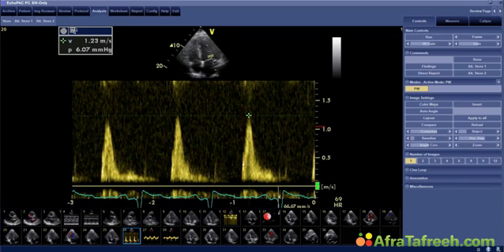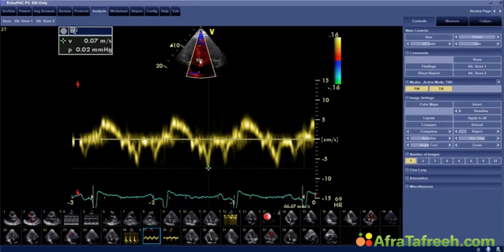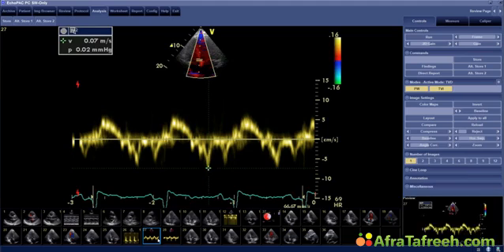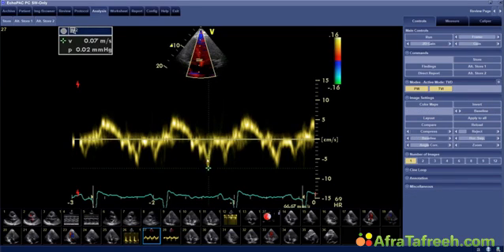So what you can do with this signal is you can look at the left ventricular filling pressure, and you can do the tissue Doppler at the base of the mitral valve. And what you can do then is you can look at the ratio between the E and the E prime. Now the ratio would be, going back to this, 1.23 divided by the maximum velocity of the E prime, which is 0.07, which is somewhere in the range of maybe 17. And normal values would be up to 15 or 12 to 15. So if you are above 15, you can be sure that left ventricular filling pressure is elevated.